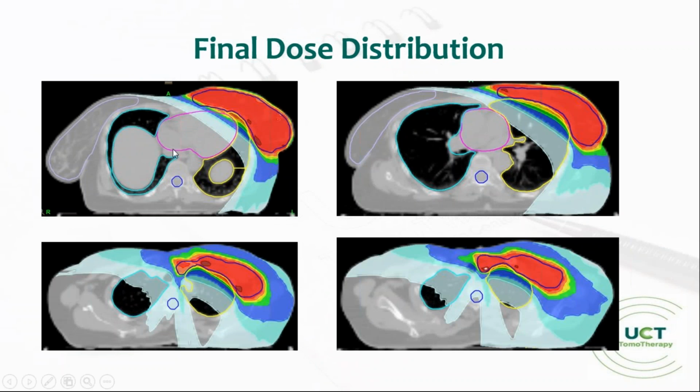So this is the bottom, and now we go upper and we go more upper, and here we see my maximum dose in the PTV supraclavicular, because here I actually should create the highest gradient in the lung.